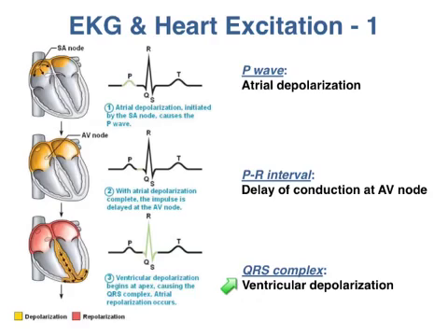The big QRS complex represents ventricular depolarization. Atrial repolarization happens during the QRS complex as well, but basically gets swamped out by the stronger signal from the ventricles. There's just so much more myocardium getting active, being depolarized in the ventricles, than there is repolarization with the atria.